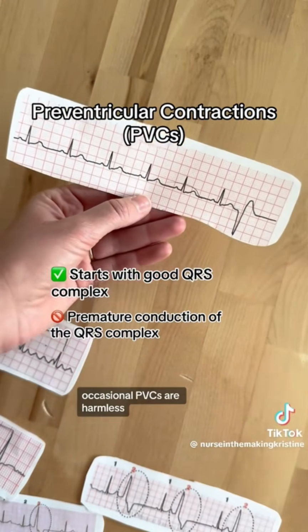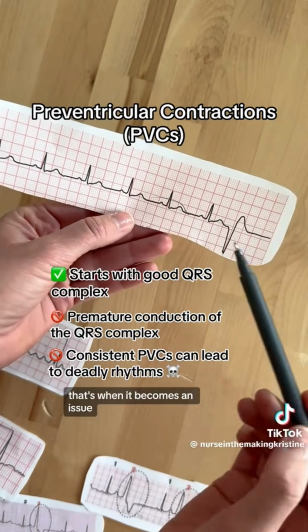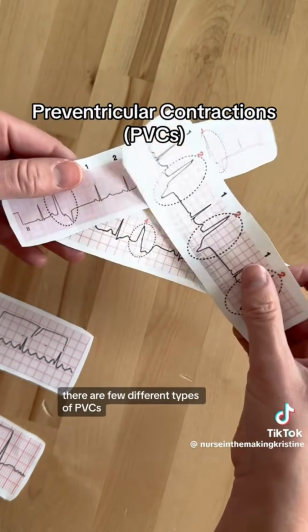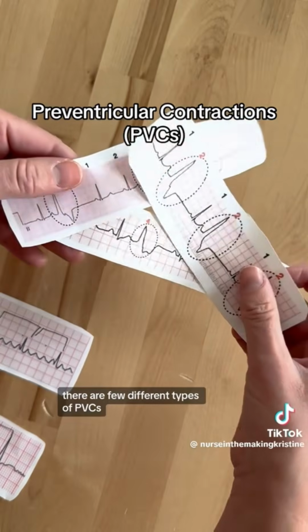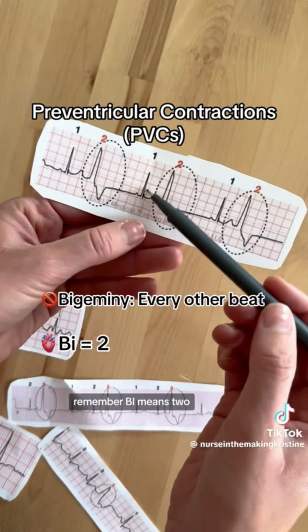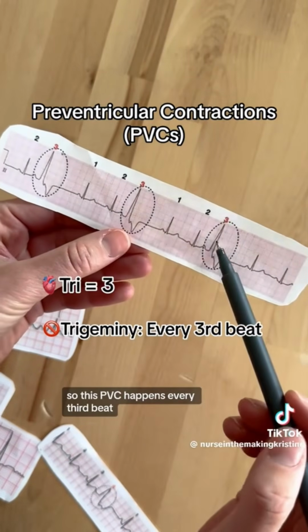Occasional PVCs are harmless, but if we have frequent and consistent PVCs, that's when it becomes an issue and actually can lead to deadly rhythms. It's important to note there are a few different types of PVCs. Bigeminy, which happens every other beat. Remember, bi means 2. Trigeminy means 3, so this PVC happens every third beat.